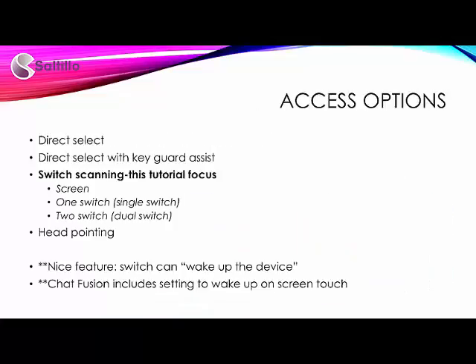This tutorial will focus on scanning options. Our systems offer direct access, use of a keyguard, or switch scanning. The Chat Fusion also offers the option to add head pointing with the ChatPoint. These options are explored in other tutorials.